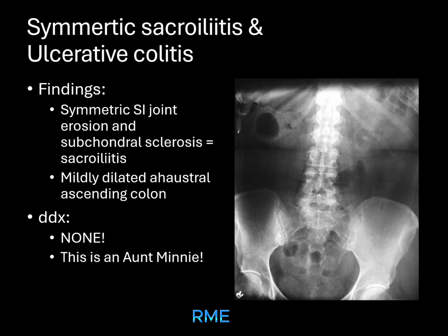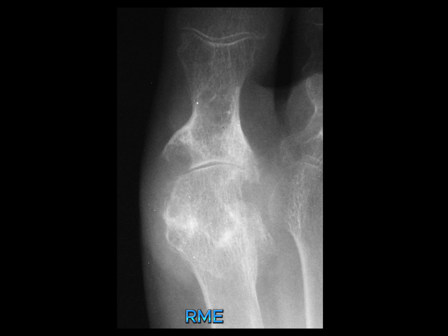Management involves anti-inflammatory medications, immunosuppressants, and possibly surgery for severe cases of colitis. Let's move to the next case. What abnormalities do you notice in this image?